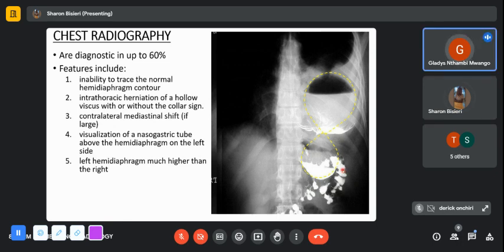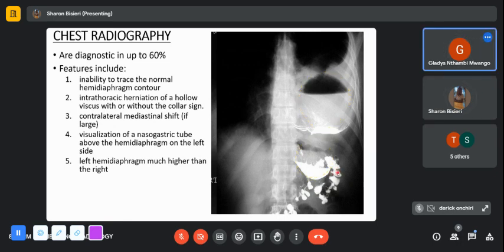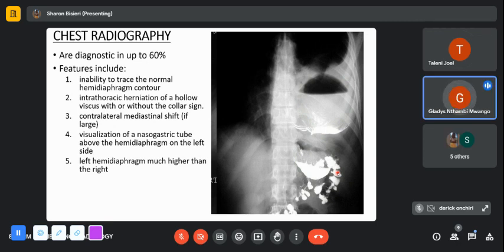You look at the previous image. Descending colon. It's a splenic. Yeah, look at the previous image. Just look at the previous image. Now you can see what the jejunum looks like, huh? And the duodenum.